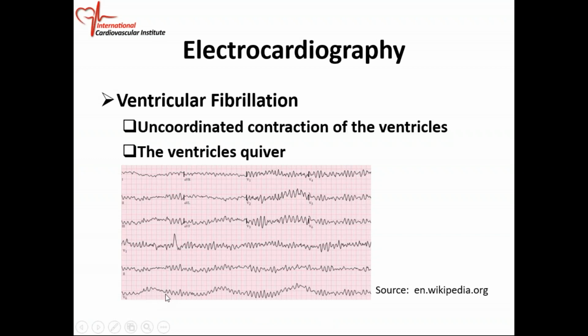So use common sense a little bit. An artifact can also give you something looking like this. But if the patient passes out and you have something like this, the only treatment is to shock the patient. This is ventricular fibrillation.